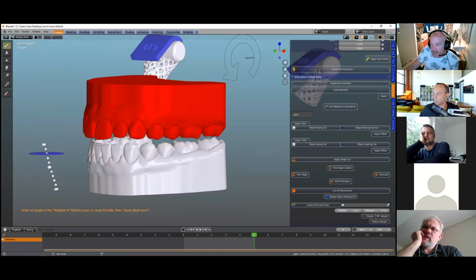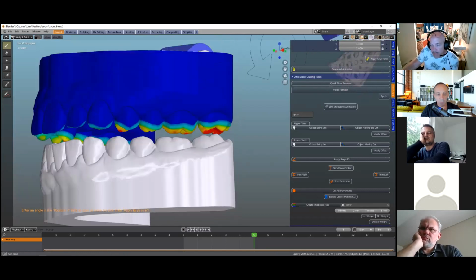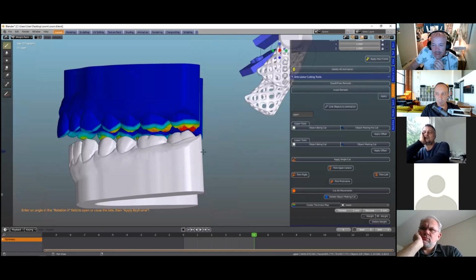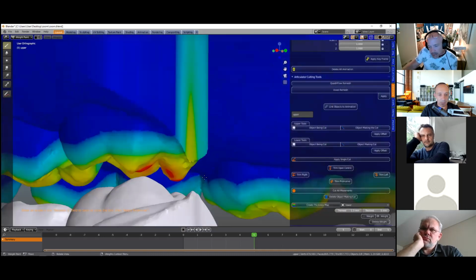And then with it being selected, we're going to select our dropper and select this. Now you'll see we've got different colors. On the bottom right-hand side, it says thinnest is 2 millimeters, which is the red zone. If I want to measure how thick this is, I can set this down. I can move this down a bit if I want to, and up. As I'm moving the slider down, 1 millimeter here. So it's about 1.3 millimeters in the thinnest area over here.